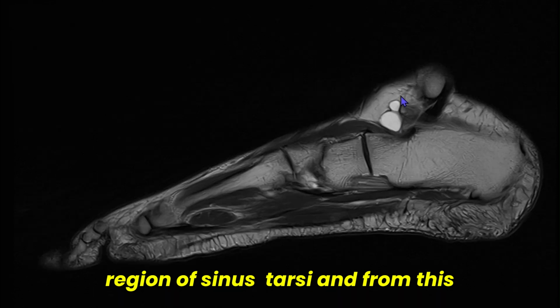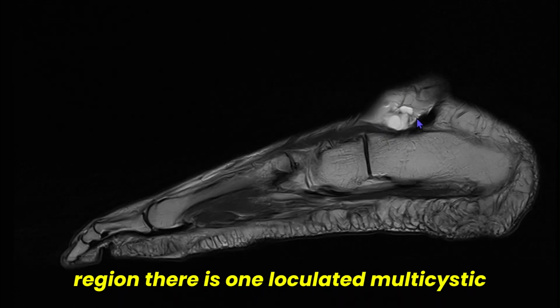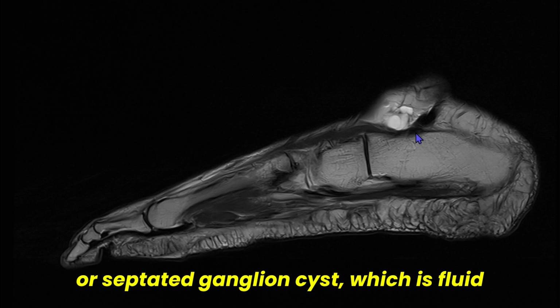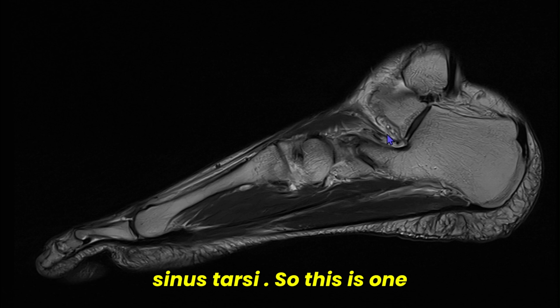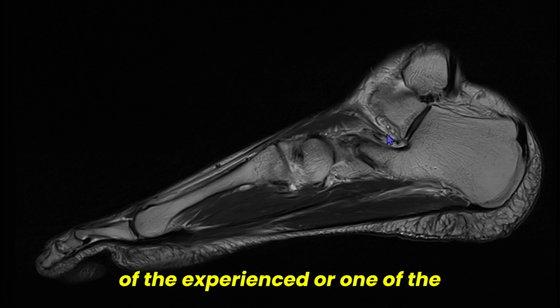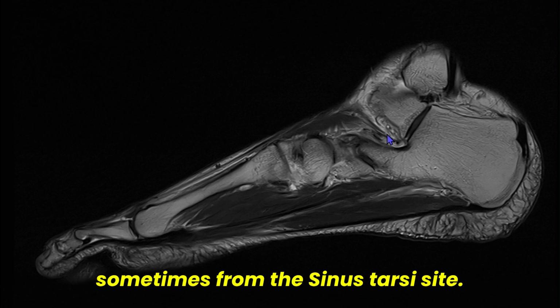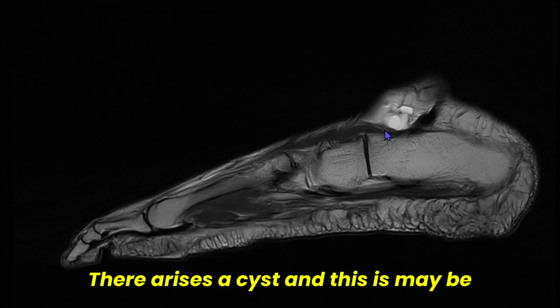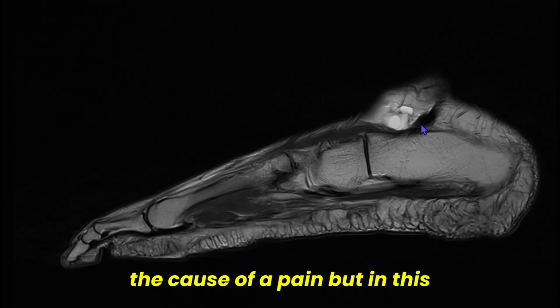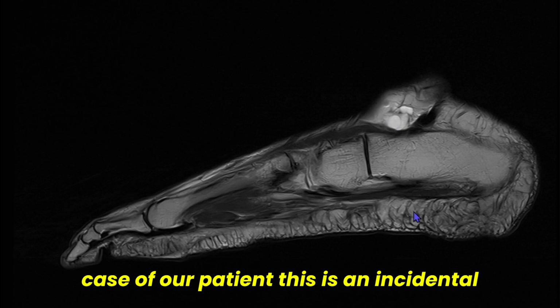from this region there is one lobulated multicystic or septated ganglion cyst, which is fluid signal intensity, arising from within the sinus tarsi. So this is one of the commonly discussed pathologies, that sometimes from the sinus tarsi there arises a cyst, and this may be the cause of pain. But in this case of our patient, this is an incidental finding.